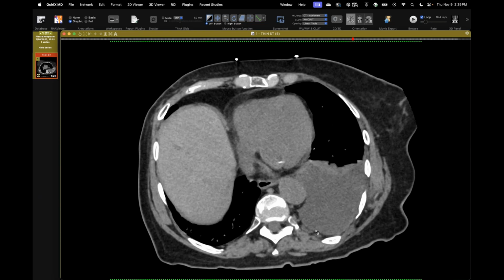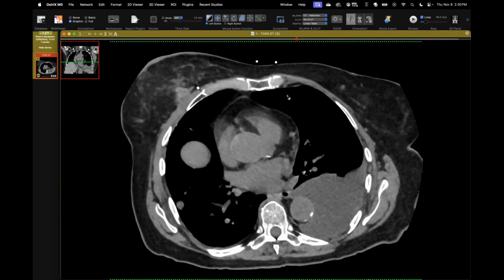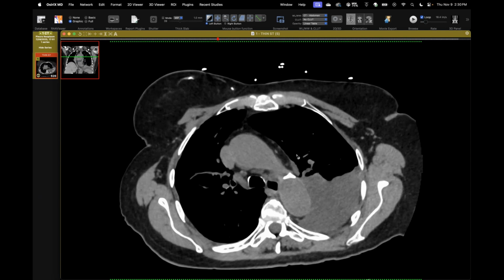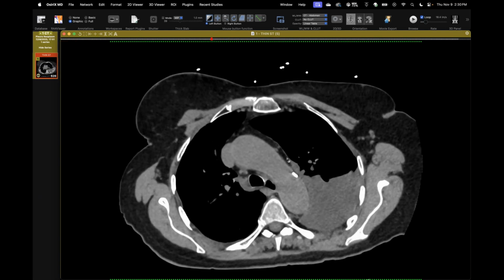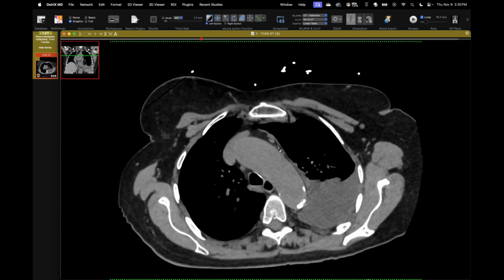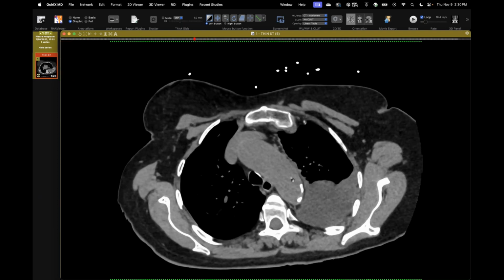Can we look some more at the mediastinal pleural surfaces, a bit higher up? Because that's exactly where you want to look, at some of those interfaces. The only area is way up high, coming off of this effusion, maybe subtle there. Even though that pleural surface is slightly thickened, one should always view that with suspicion in a person with an undiagnosed pleural effusion to start with. Even that degree of mediastinal pleural thickening is always concerning.